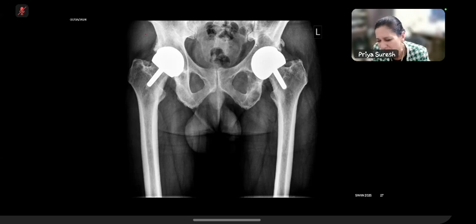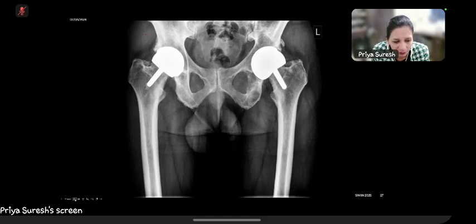Okay. And we know that even when you're looking for tumors and things like that, the plain film can underestimate. But what I'm saying is the plain film has given you the clue that there is osteolysis there, and you have to go and investigate. Because that will be the first thing. We won't be doing MR the moment the patient comes. It will be the plain film that you will do first when they're presenting with pain.